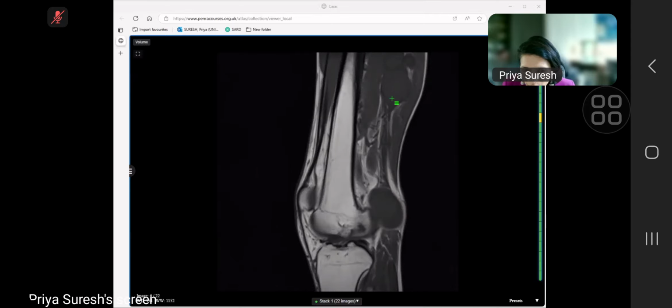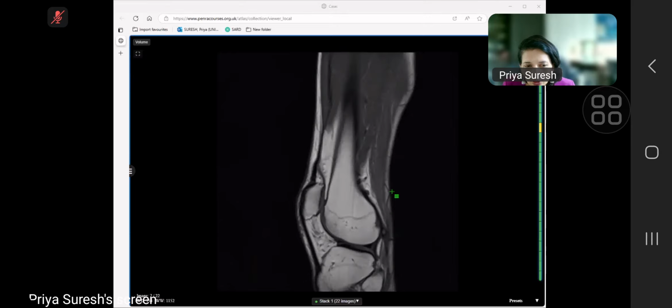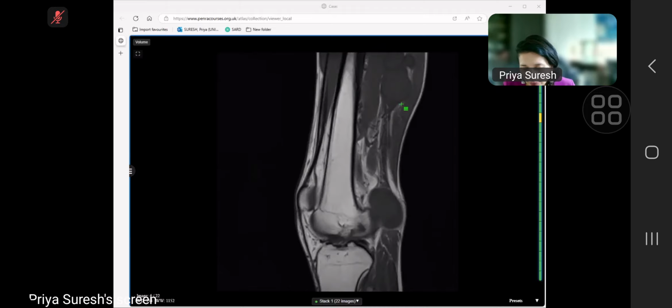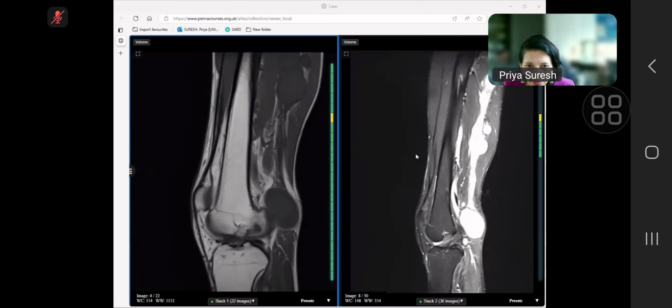I wasn't sure whether you appreciated it the first time when it went up. So just be a little bit careful not to just focus on that, but look at the other lesions as well. I think you eventually saw it when we put up the STIR images, because you can see many more lesions there.